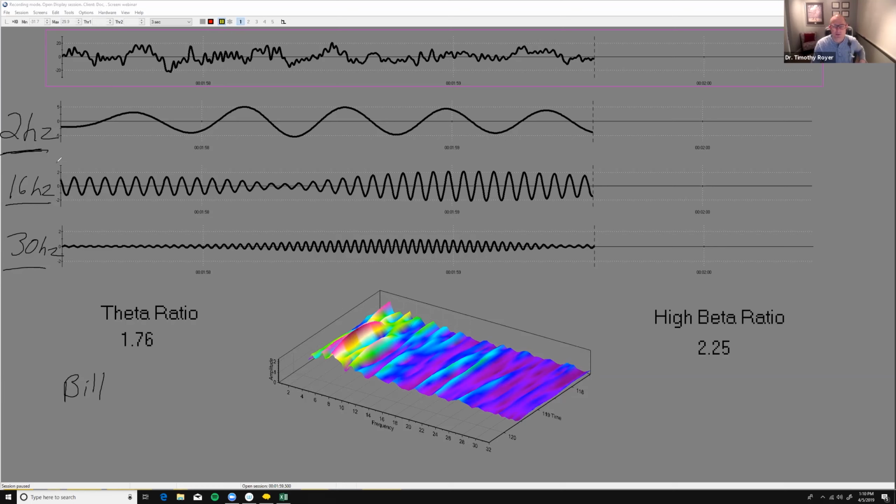So there's different frequencies. That never changes, but what does change is the height of that frequency. So look at this one. You can see it particularly in the 16 hertz one. You see the 16 hertz, here's 1 second. And what do you notice about the 1 second?